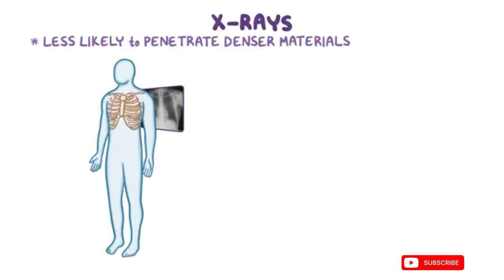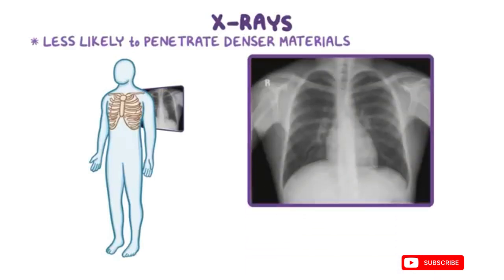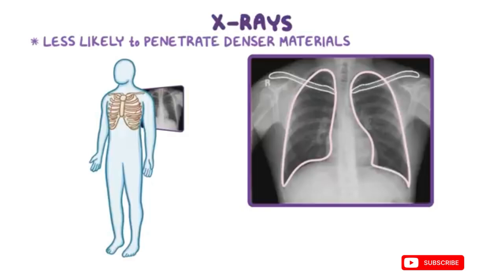Conventional X-rays that show white bones on a black background are like photographic negatives. The darkest parts of the film, like the lungs, are areas where more photons can penetrate the body. In contrast, the sharp, bright white areas are where the dense bone material blocks photons from getting through.